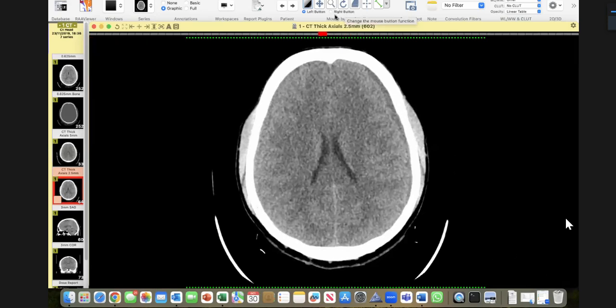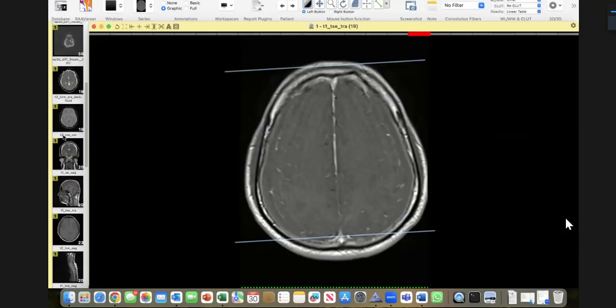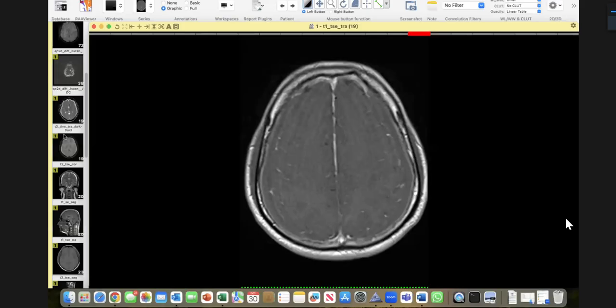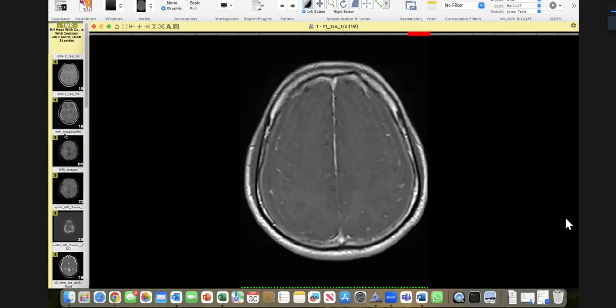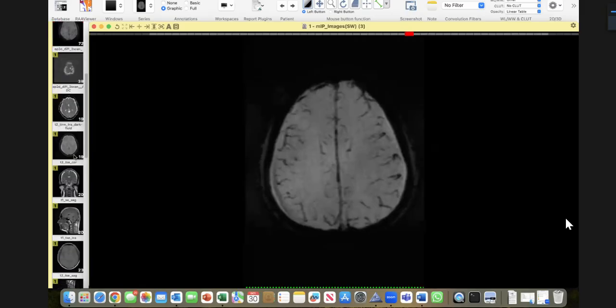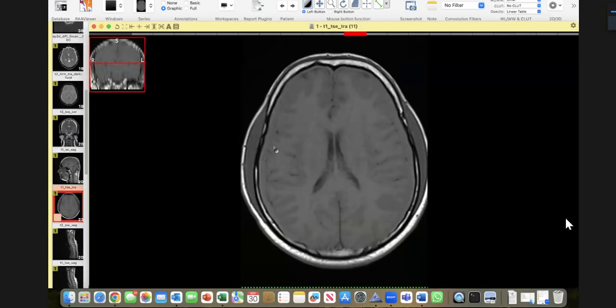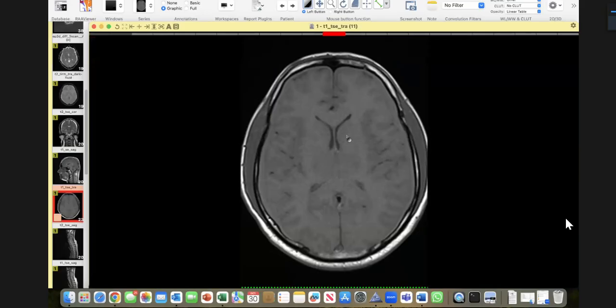Now, in the MR, I intentionally gave you a FLAIR sequence. This was a giveaway actually, but you got confused and took the FLAIR for a T1. Please remember my basic teaching. I always say that you can confuse a FLAIR with a T1.